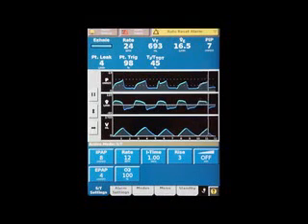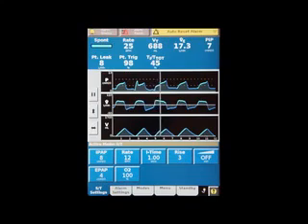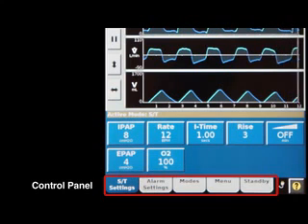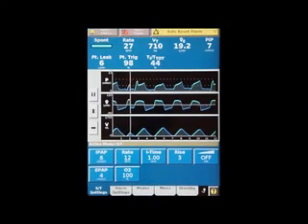Non-invasive ventilators for inpatients typically have a variety of modes, settings, and alarms. On this standard ventilator, the physician can toggle between ventilation settings, alarm settings, and ventilation modes by pressing the buttons at the bottom of the screen. This standard ventilator display has two main panels.